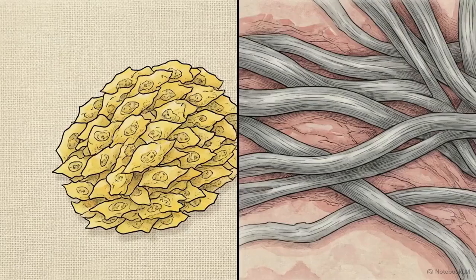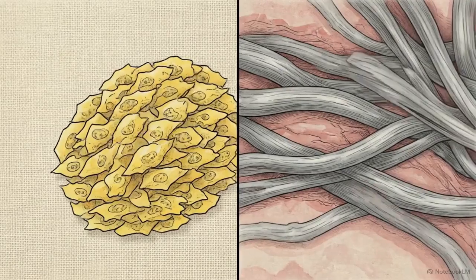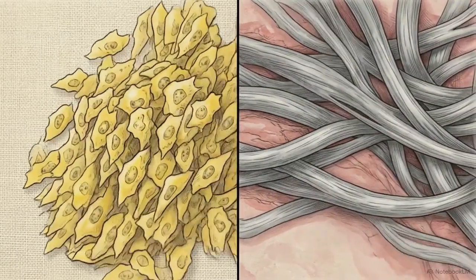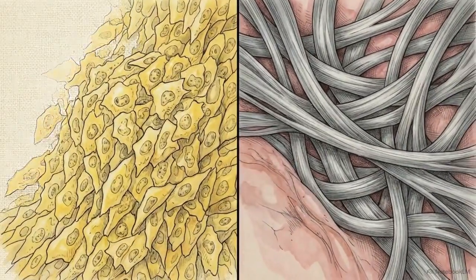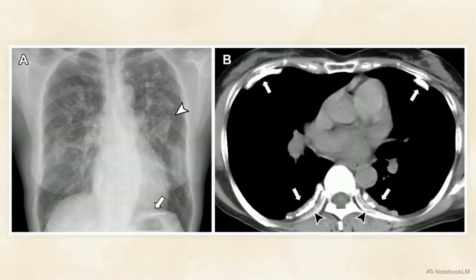The most difficult diagnostic task is expansion by tissue, where we must differentiate stable environmental fibrosis from active malignancy. Benign pleural plaques from asbestos exposure present a specific radiographic signature. These dense calcifications create the irregular holly leaf sign. CT confirms their distribution. The plaques exhibit abrupt shoulders, strictly following the parietal pleura along the ribs and diaphragmatic dome, while notably sparing the apices.